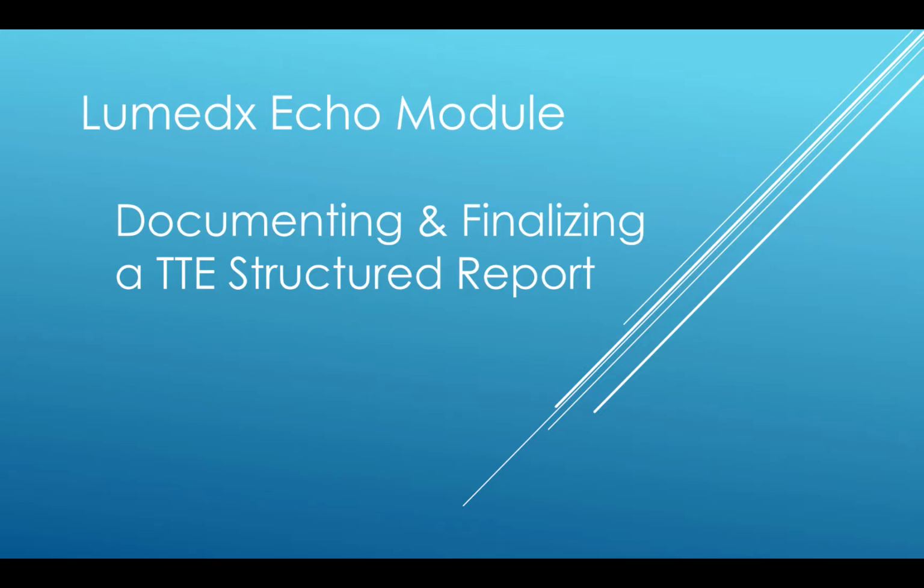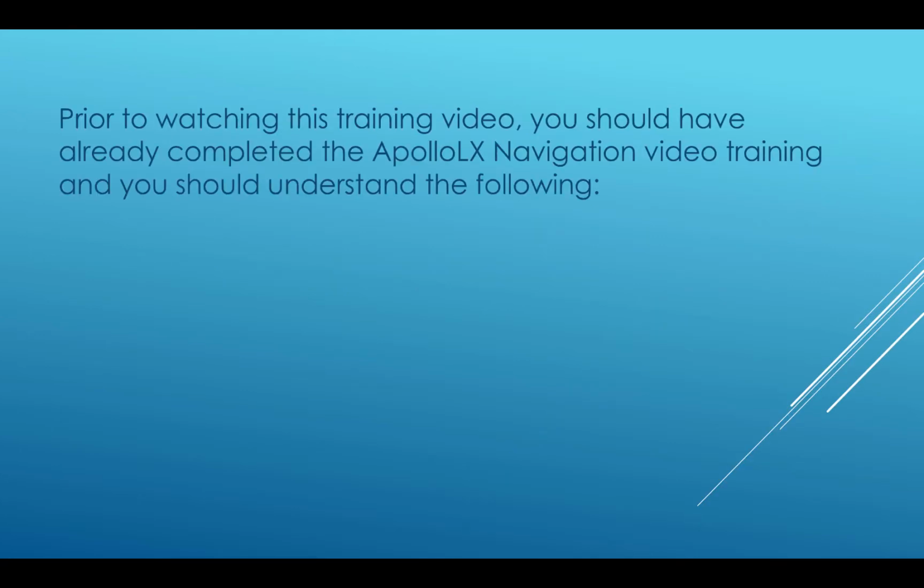Lumedx Echo Module, Documenting and Finalizing a TTE Structured Report. Prior to watching this training video, you should have already completed the Apollo LX navigation video training, and you should understand the following. 1. Know the different icons in Apollo LX.